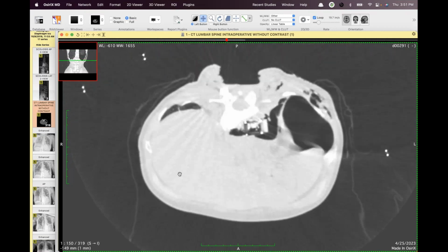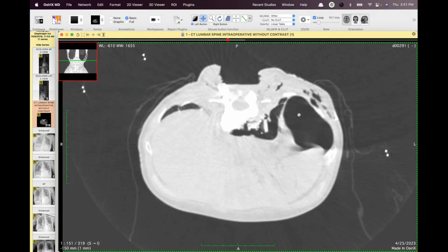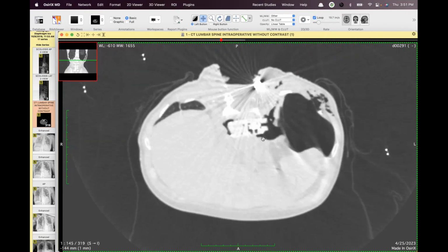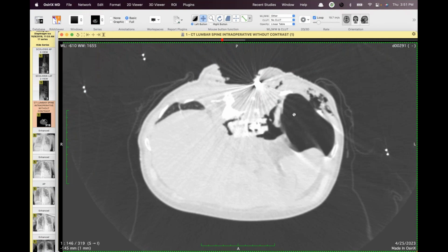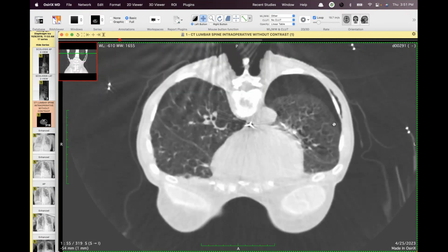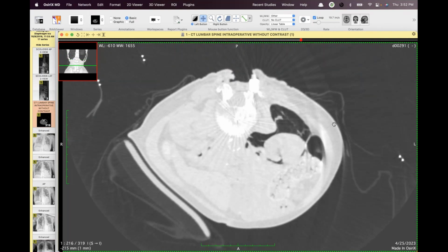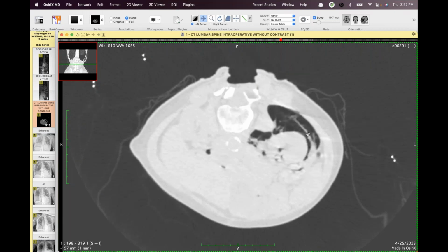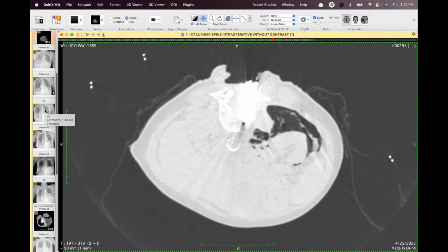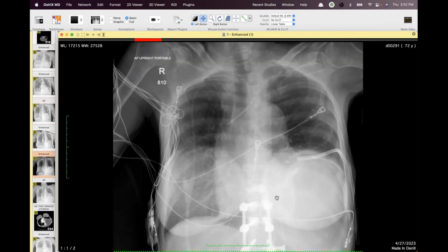Howard, I think to answer your question, instead of going under the diaphragm, they went through the diaphragm to put this big interbody bone cage there, probably via this big defect laterally that you were talking about. Okay. Gosh. And then there's some retroperitoneal air as well. Wow. So that was one of those ones, especially because it was the fourth or fifth radiograph, but it just didn't look right to me. So I went back digging.